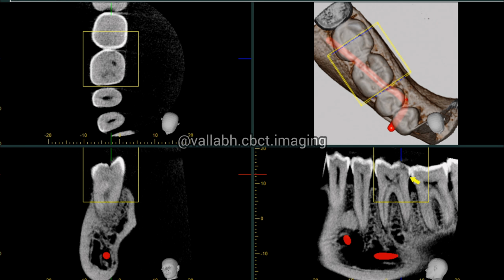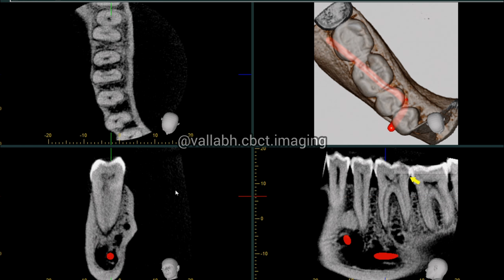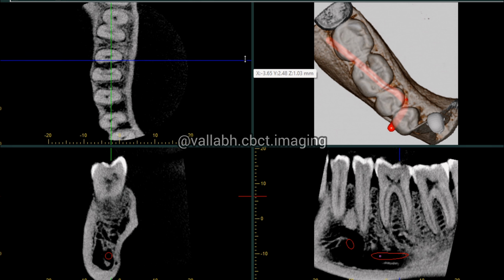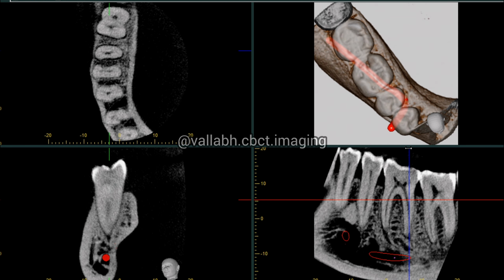So doing the root canal study of the case, we can see there are two canals over here when we check the mesial aspect. So mesiobuccal canal and mesiolingual canal that unite to have a single common exit, and similarly a single distal canal that is passing by when studied along the long axis of the tooth.